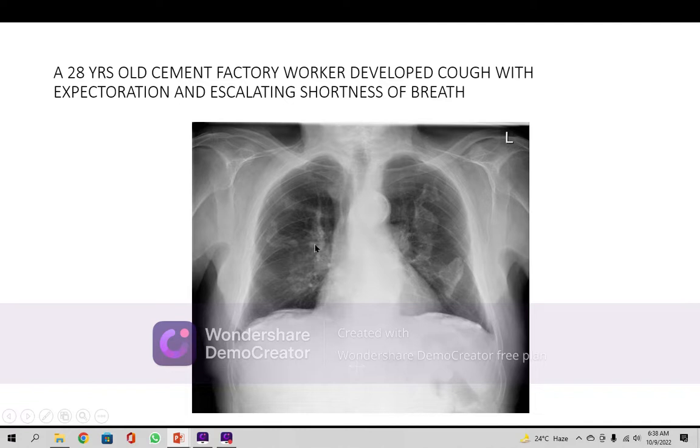Acute inflammation? No, it is not a result of acute inflammation. Chronic inflammation, yes, probably. The patient had developed tuberculosis previously and it results in fibrotic patches, what is called patchy opacity. The possibility is there. Some of it is calcified. And then other fungal infections can cause the banded appearance. It is a possibility in certain countries.